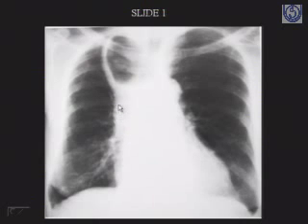Okay. Plus, if you see here, can there be mediastinal lymph nodes? Mediastinal lymph nodes can cause abnormal widening of the mediastinum. Any normal structure which lies in the mediastinum can cause widening of the mediastinum. You could have enlarged lymph nodes. You could have vessels, pulmonary vascularity, causing widening of the mediastinum. An SVC shadow on top may cause it, but in this case the SVC shadow is not there.